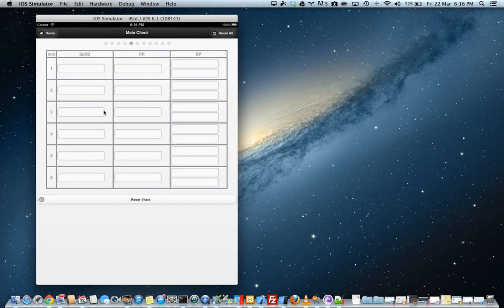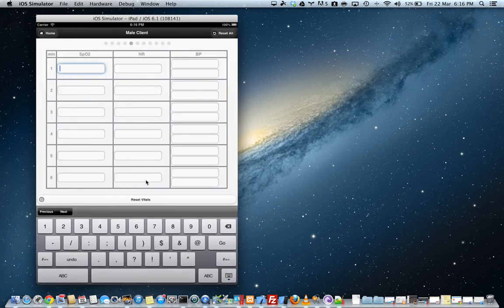And let's move on, and let's see if we can fill these out. So I'm just going to fill these out without proper obs. I'm just going to do it nice and quick for the sake of having a short video. So put that in there.